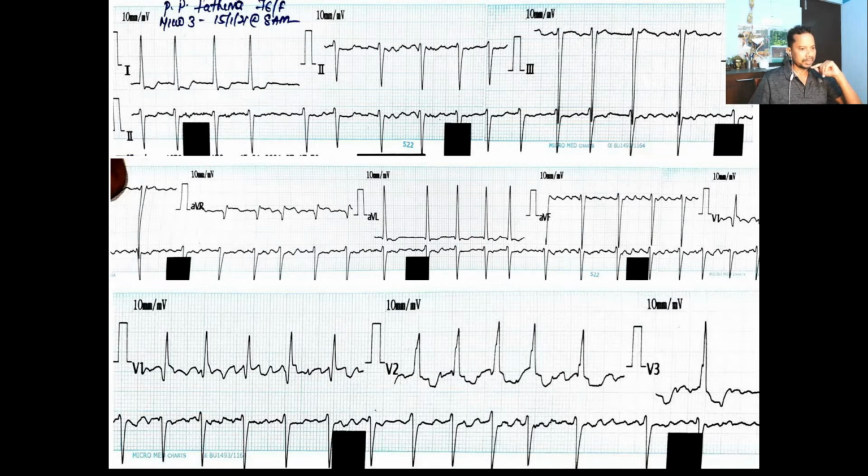And now we further again look at the complexes out here. In V1 you see P wave, R, S, R dash pattern, rabbit's ear. So one R is small, one is big. Okay, so that is called rabbit's ear, that you will see in right bundle branch block.